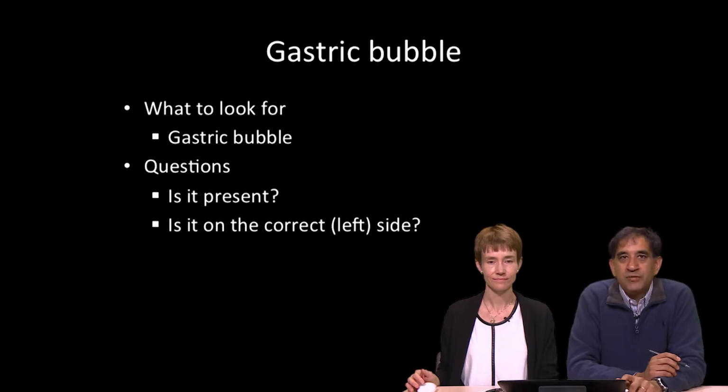And we're all the way up to G for gastric bubble. When we are looking at the gastric bubble, the questions that we have are, is it present? And then if it is present, is it on the correct, or left, side?